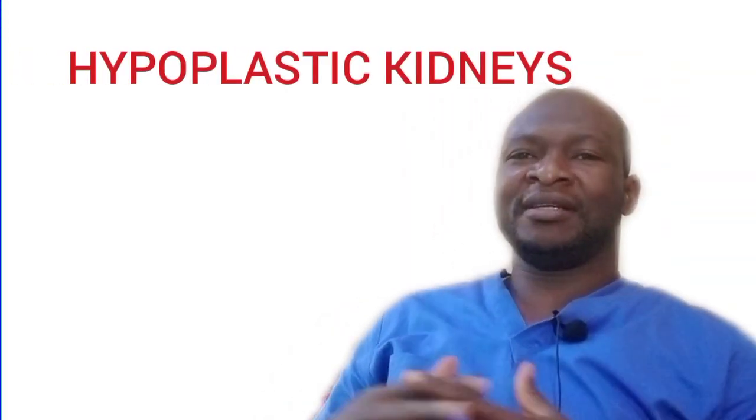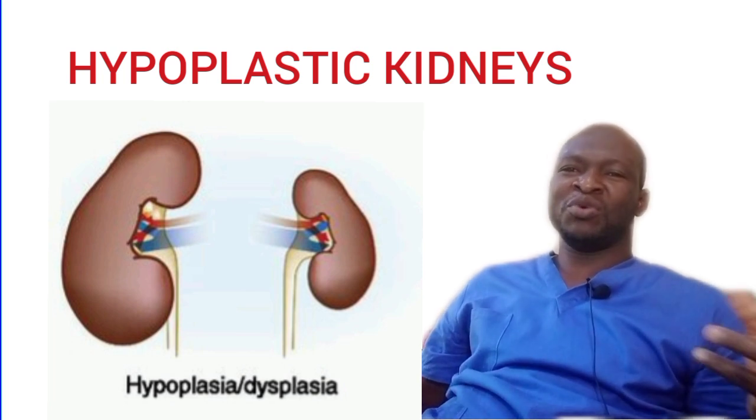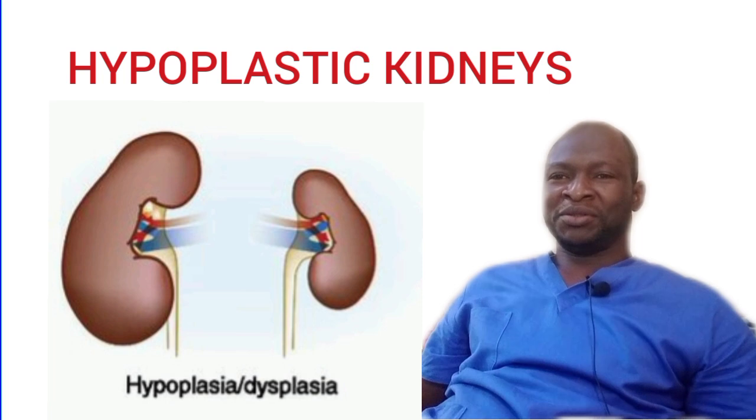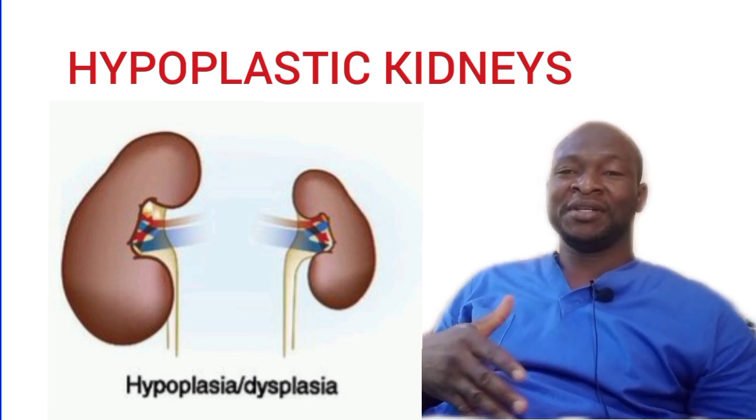This is the bilateral agenesis of the kidney, non-visualization of the urinary bladder, oligohydramnios, and pulmonary hypoplasia. So, looking forward, we'll look at hypoplastic kidney. Hypoplastic kidneys in ultrasound, basically these are small, underdeveloped kidneys. Unilateral with a compensatory hypertrophy of the opposite kidney.